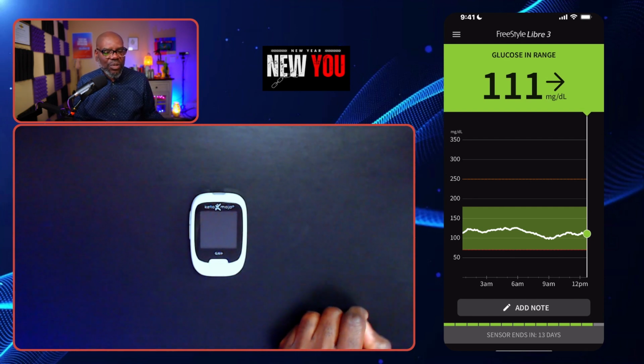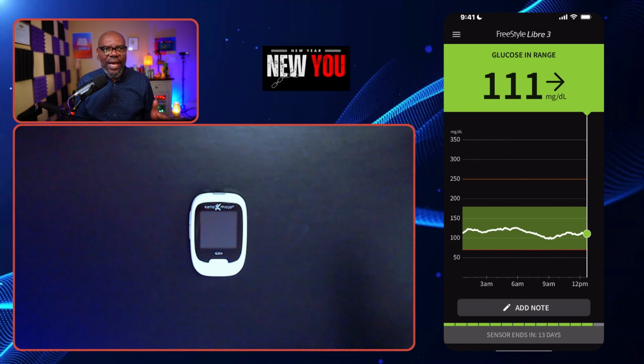But a continuous glucose monitor gives us a blood sugar that is supposedly continuous. Now it simulates continuity, but it's actually not continuous, right? It is mostly continuous. Most of the continuous monitors will check blood sugars every 1 to 5 minutes. So you apply the sensor by putting it in the back of the arm. Go back and watch that video that we did.